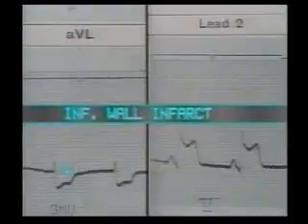The third type of ST segment depression is due to myocardial ischemia and infarct. At the onset, let us clear our mind from the reciprocal ST segment depressions in acute myocardial infarction. This is inferior wall infarct, where leads 1 and AVL show ST segment depression and 2, 3, AVF show ST segment elevation. The anterior and inferior group of leads show opposite effects on ST segments.